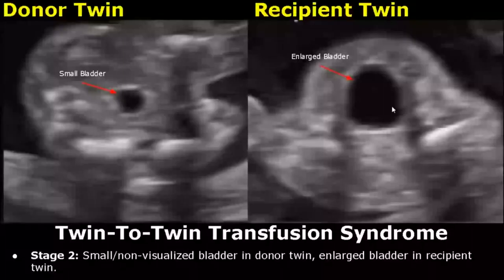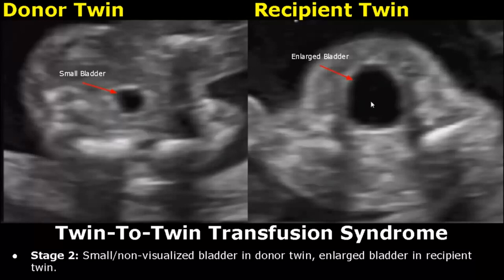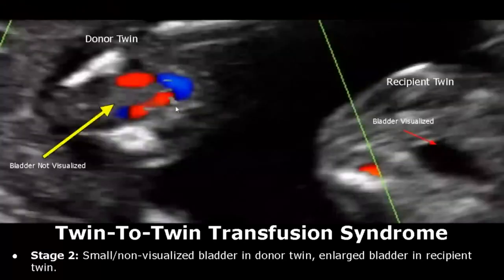In stage 2, the donor twin will have a small or non-visualized bladder. This is in association with oligohydramnios. The recipient twin will have an enlarged bladder along with polyhydramnios. Here is another image showing non-visualization of bladder in donor twin, and the bladder is visualized in the recipient twin.